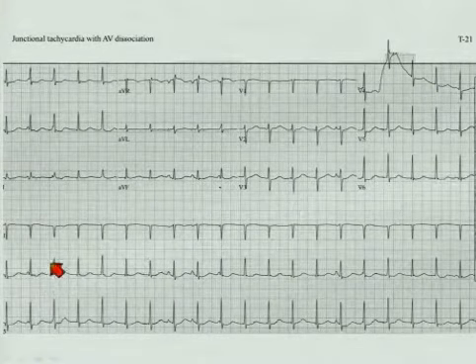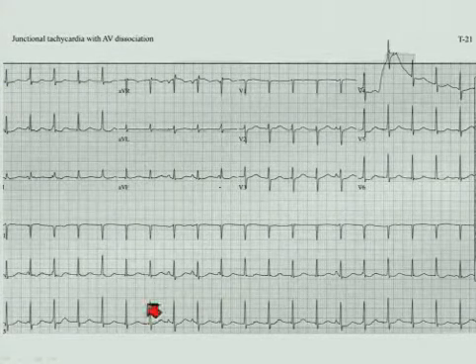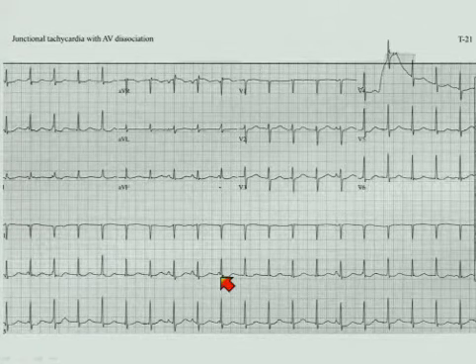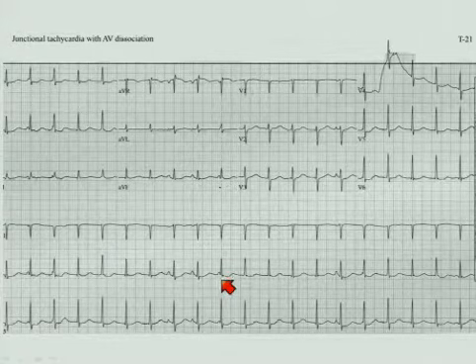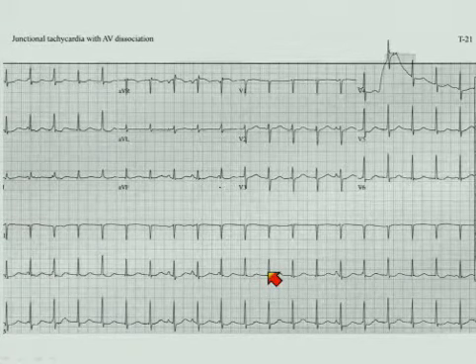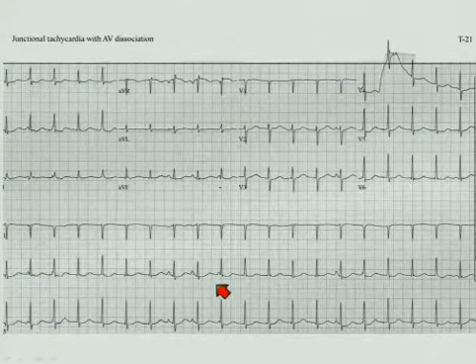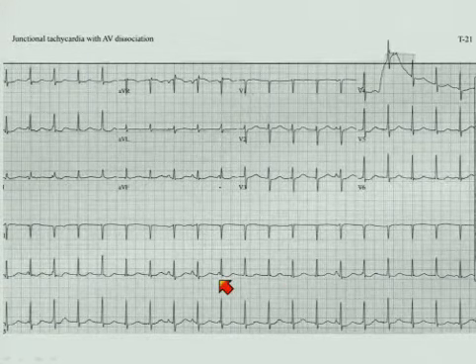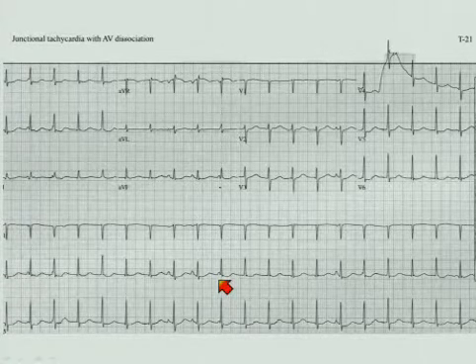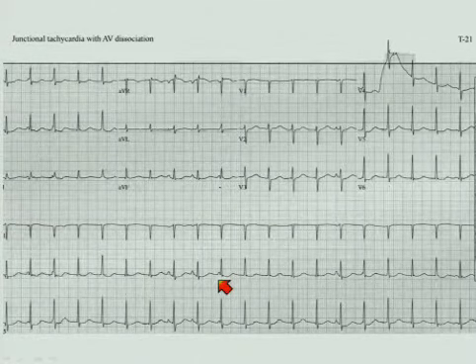So let's look here. In this patient, we see a regular rhythm occurring very regularly, and we see P waves, but we see P waves marching through independent of that regular rhythm. So this rhythm then is what? It's an accelerated junctional rhythm. And this rhythm is what? It's a sinus rhythm. But they are totally independent. So there is AV dissociation here. None of those P waves capture. Is there any heart block? No, there's no heart block here.